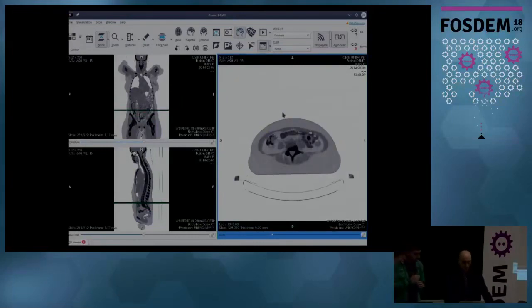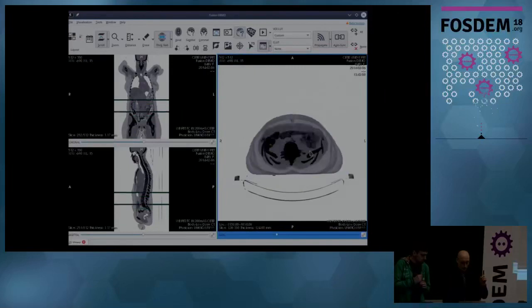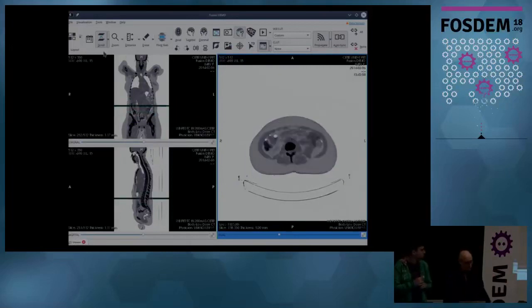What we can do is take several slices and generate one single image which summarizes them. This is called thick slab. So I put, for example, 120 millimeters, and as you can see, now we see the pelvis or the ribs, and we are visualizing this thick block of images, okay? I disable this because it is quite CPU intensive.